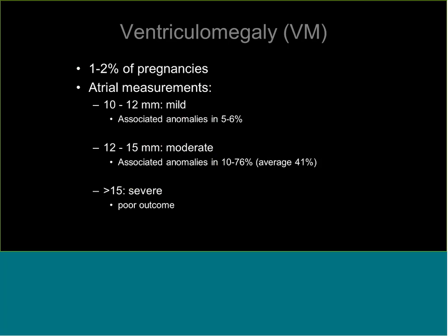Okay, so we have about maybe 5 or 10 minutes to give some time for questions at the end. So the most common referral for fetal MRI for cerebral abnormalities, at least, is ventriculomegaly. Because with ultrasound, obviously, it's very easy to recognize the ventricles in the fetus and to measure them, and if the ventricles measure too big, then more often than not, I guess, these fetuses are referred for an MRI. Is that fair to say?